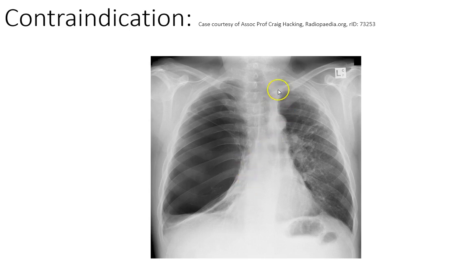Oh, I think there's another one up here, look. Can we see that there's this sort of thickened area around a darker one. So I think we can, oh, and more in here, look. Can you see that? Thickened around these dark areas.